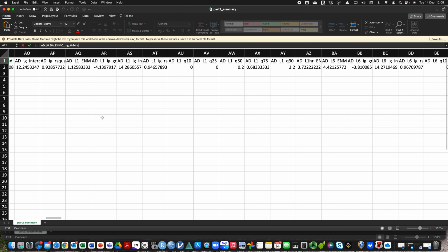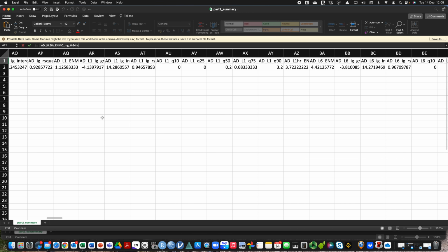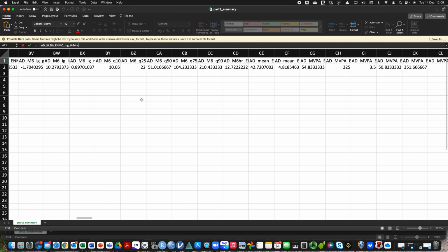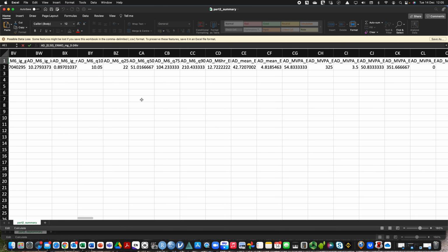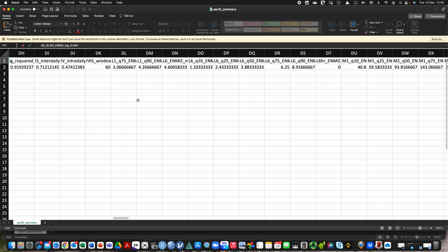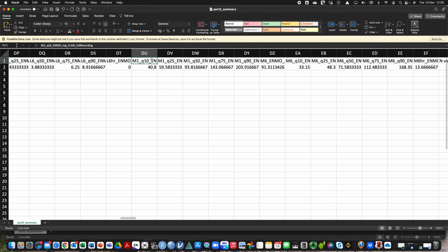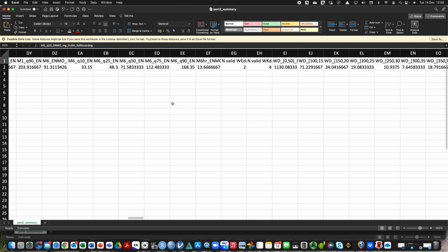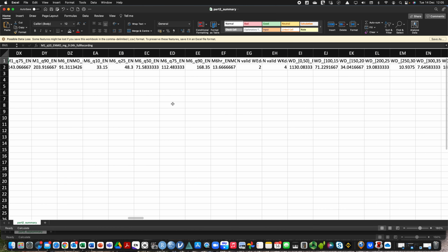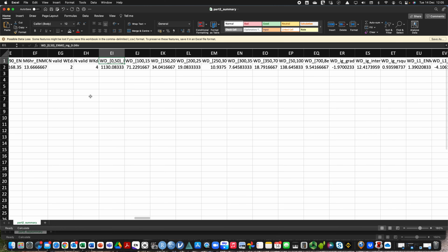Okay. Just check that you've got all the data that you actually need, or all the variables that you need in the summary file, just in case it's not perhaps giving you what you want, but that might be in the day by day. So AD goes across, so we're still on AD, yes we are, no, it's gone to full recording there. So full recording pops up again here, so that's a bit annoying because then you've got to find it. And so I would typically copy these out into another worksheet, get rid of the stuff which we don't need, or hide them. This is what I want to get to here.